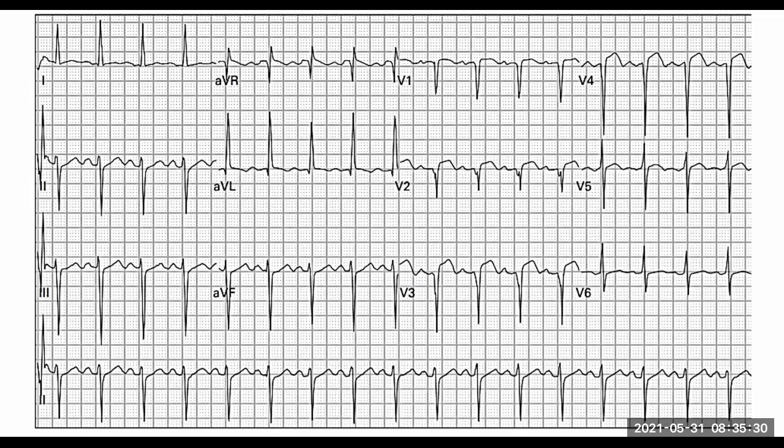Not at all. If you look here, right? So basically, the best place to look when you want to determine ST elevation or depression, you can look between the P and the R, for example. You see there's no activity. All right, so when there's no activity, that's called our isoelectric line, our zero line. So in other words, when the heart is at rest, it comes to zero. And then ST elevation or depression depends on its relation to that.